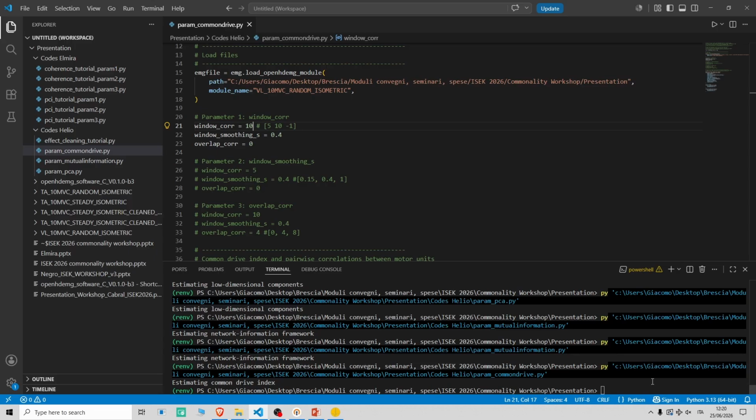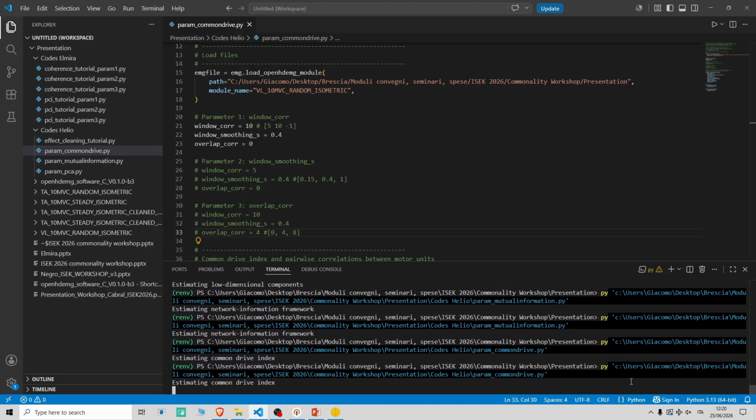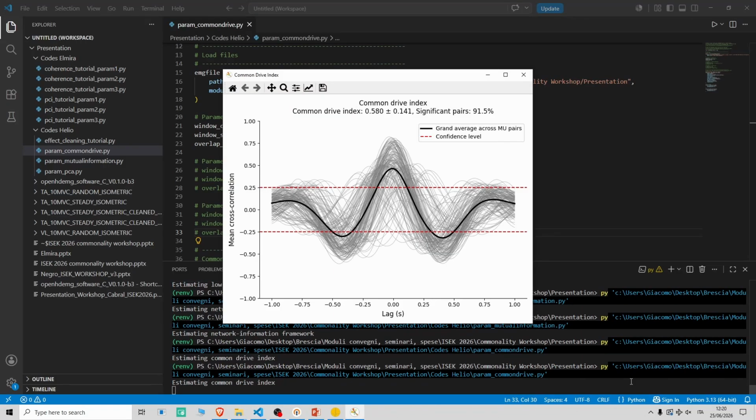Yeah, no, right now I'm using the common drive index. Okay? And feel free, if you have any questions, just raise your hand and you can ask. So right now, I will do it with a bit bigger window. And then I will run.